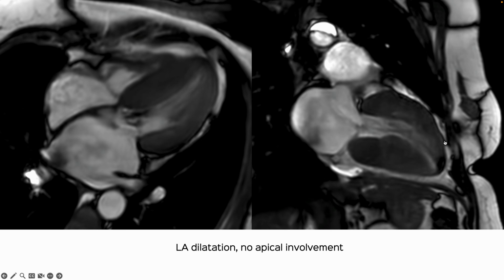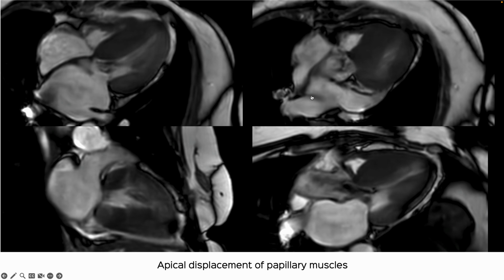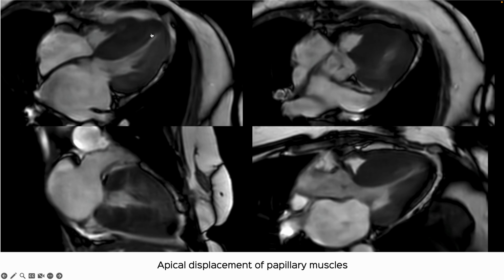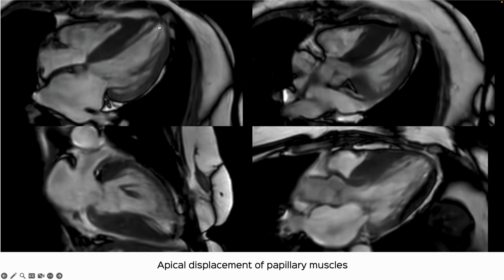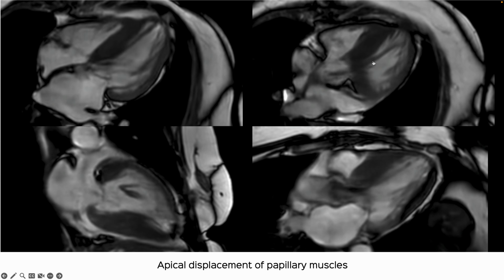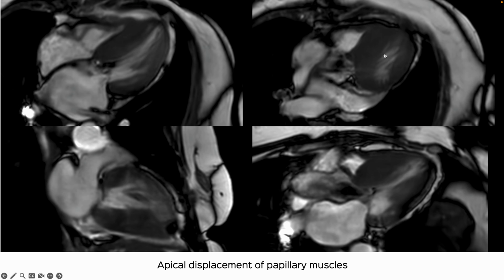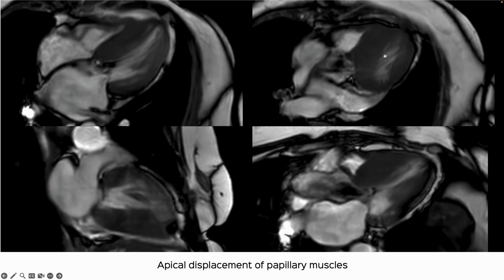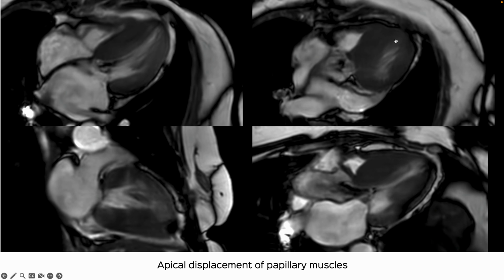The LA is dilated and there's no apical involvement, and that is something that we would mention. Then what we see, and we've started reporting, is the apical displacement of the papillary muscles. So these patients have an unusual attachment of the papillary muscles both towards the apex as well as towards the mitral attachment, and this is what leads to a lot of these problems, including the SAM, the LVOTO, and including changes in the apical region and in the mid cavity. So this is what we have to recognize.